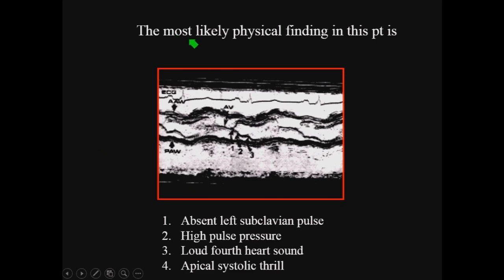And this is another patient. And we are looking at this patient, and this is very strange. This is the aorta. Remember, the aorta is usually two parallel lines that you can tell very simply, and behind the aorta is the left atrium. But I am looking at the QRS. Something is very wrong. You see that the aortic valve opens here.